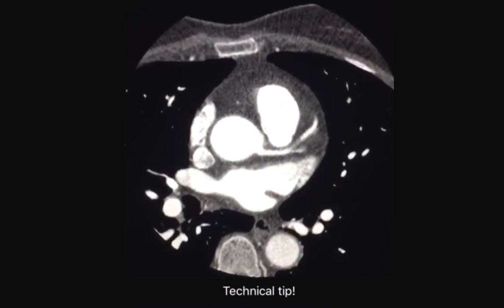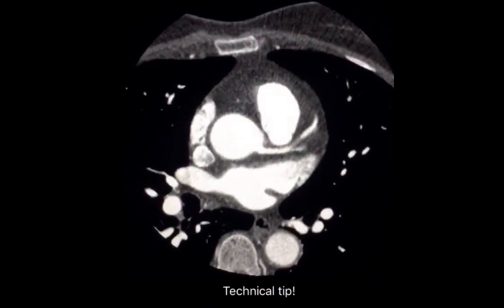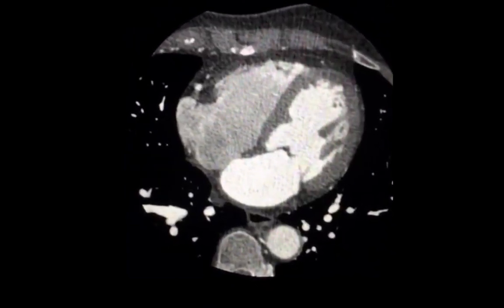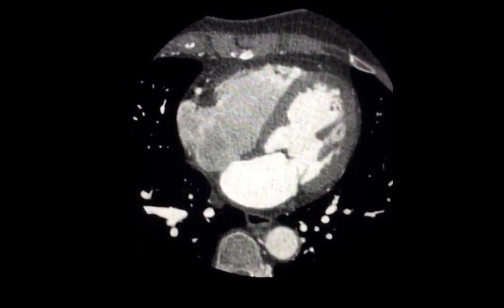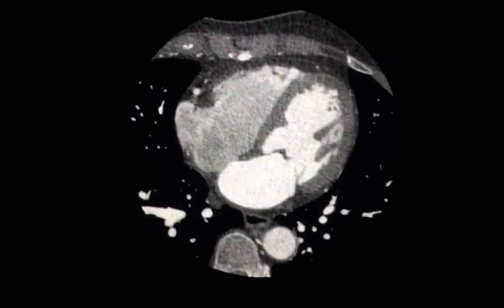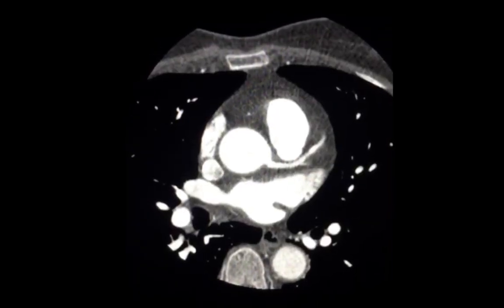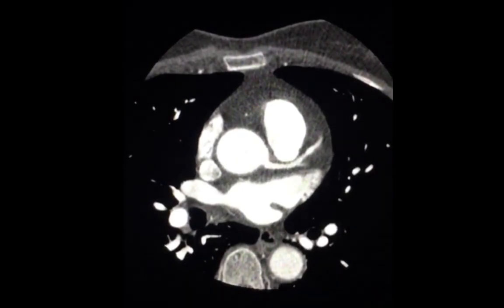Today's case is about a small technical detail that you could use when you're doing your cardiac imaging rotation. Since the heart is a rapidly moving structure, it's difficult to image this by CT, and the way we do that is by synchronizing the image to an ECG. The ECG strip is simplified so that the time from one R wave to the second R wave represents one cardiac cycle.